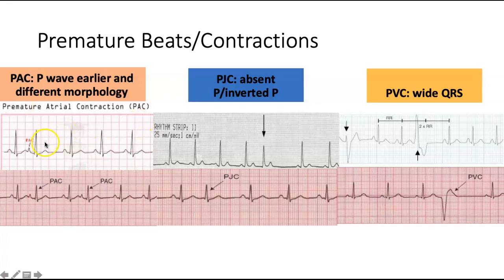In a premature atrial contraction, there will be a P wave. It will look a little wonky, a little bit narrow when you compare it to a regular P wave in the rhythm. And as you can see here, this was 300, 150, 100. So we have a sinus rhythm here. This R to R ratio is consistent. And unfortunately, the beat came a little bit too soon. With this premature atrial contraction, the heart was able to reset on time and continue on.